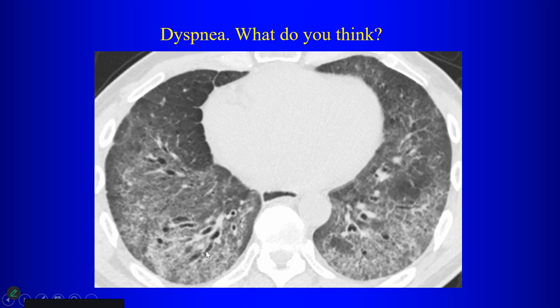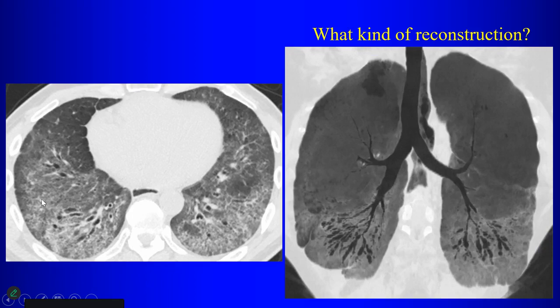And it's predominantly ground glass. Is there honeycombing? No, there's no honeycombing. You said that you think that's subpleural sparing. So what pattern is this? Yeah, so this is an NSIP pattern. The NSIP pattern does not have honeycombing. It has ground glass, can have peripheral distribution, and evidence of fibrosis, traction bronchiectasis, but no honeycombing. And subpleural sparing is a feature that is specific for NSIP.